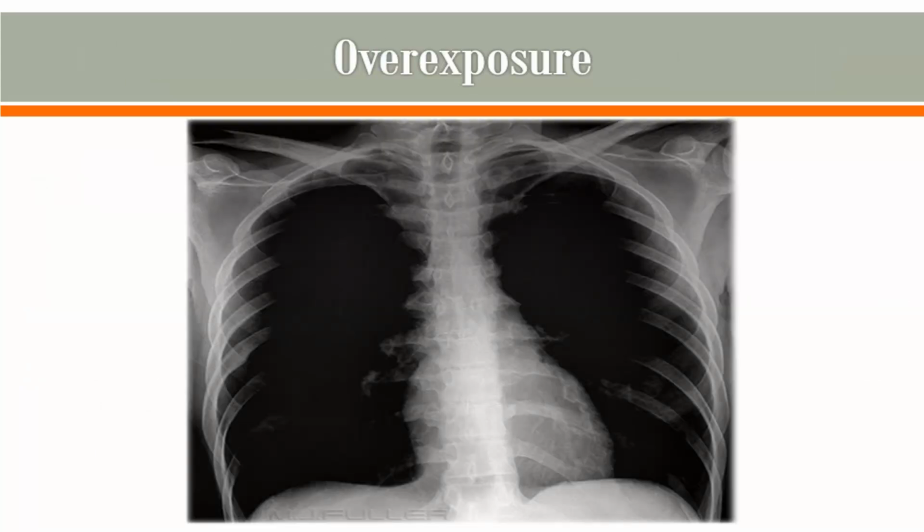In this example radiograph, you can see that there is no information in the lung region. No change in the window width or level will bring this information back. The lung markings and the posterior ribs are saturated with too much information, meaning too many x-rays penetrated the tissue, and based on that information received, there is nothing attenuating or blocking the x-ray photons to provide a shade of gray. A saturated area like this contains no diagnostic information, and it must be repeated.